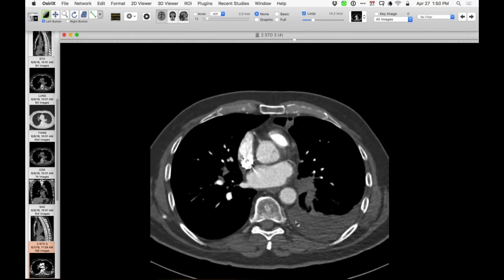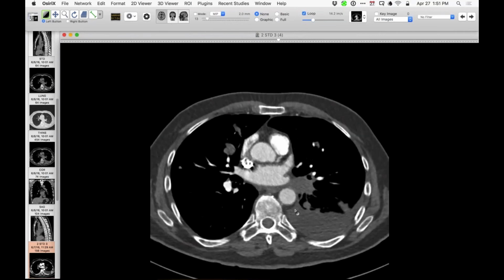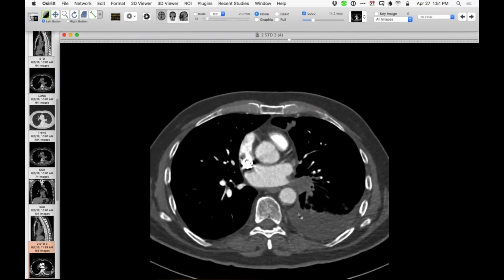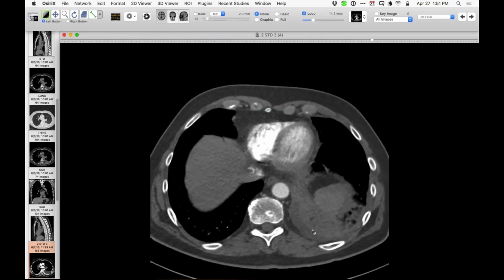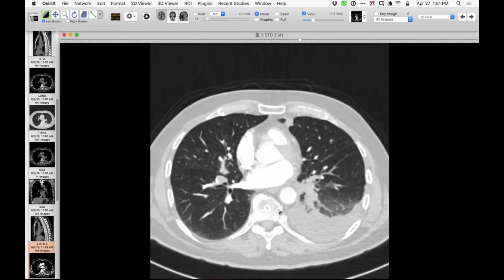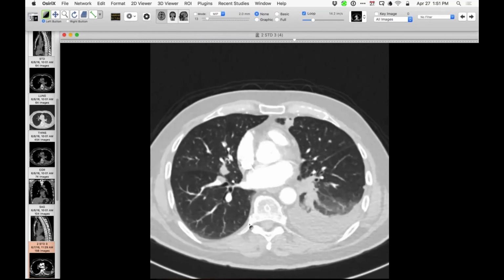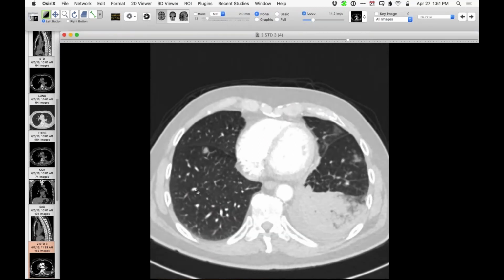This patient has metastatic sarcoma from an extremity, and I think this is all tumor there with occlusion of both arteries and encasement occlusion of the left inferior pulmonary vein with resultant substantial ischemia. And I think undoubtedly hemorrhage and/or hemorrhagic infarction involving that lung. It looks quite awful. So a pretty dramatic case of that. He obviously has extensive metastatic disease to his chest as well. So I think there's no reasonable alternative other than this as an explanation, I think.